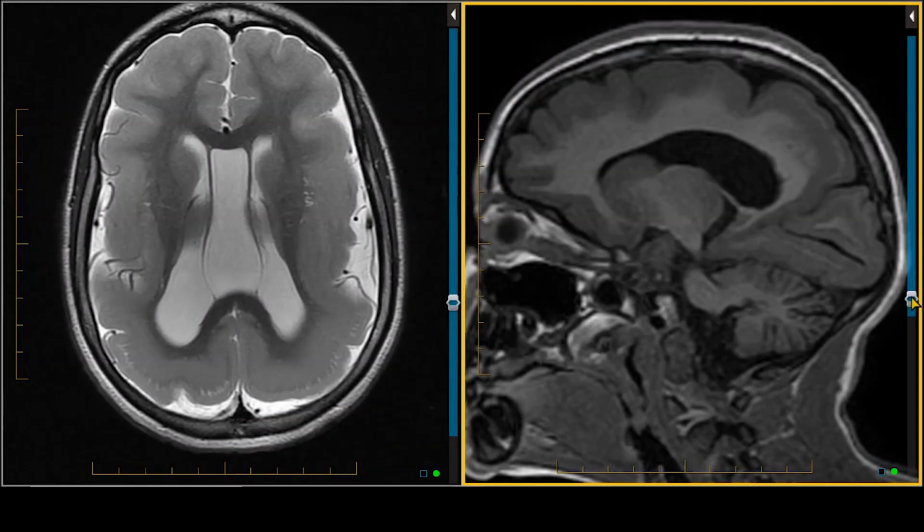If I look on the sagittal image, we can see the parieto-occipital sulcus, calcarine fissure, the cuneus, very, very rudimentary sulcation. We're not seeing a lot of surface features. The lingual gyrus, very few surface features. The precuneus of the parietal lobe, similarly, we're seeing a paucity of sulcation, we're seeing the overlying gray matter, we're seeing the cell-sparse zone, and we're seeing this band-type heterotopia.